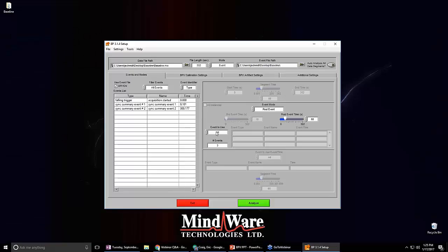And these are all of the events that were captured through the in-acquisition system and stimulus system, such as ePrime. If you had events that you needed to add afterwards, then you're going to load that file into BioLab, and in there we have our event editor, which you can use to manually enter events. Let's say you had a video acquisition and you wanted to go back in there and say when they moved and stuff. You could simply put those events in, and then they will appear on this list so that you can look at those and the data at the same time.